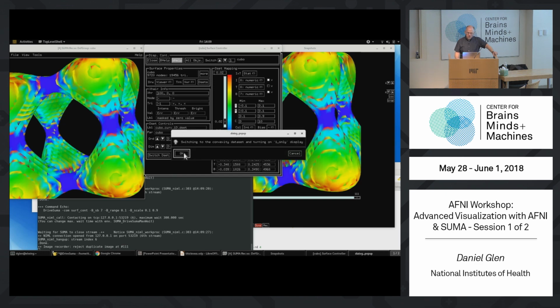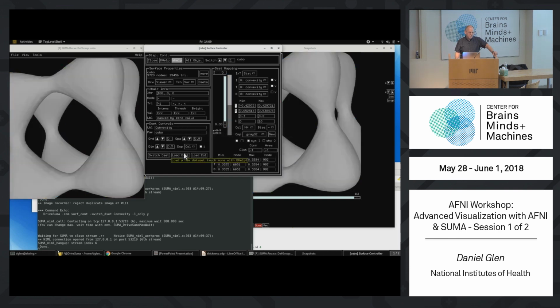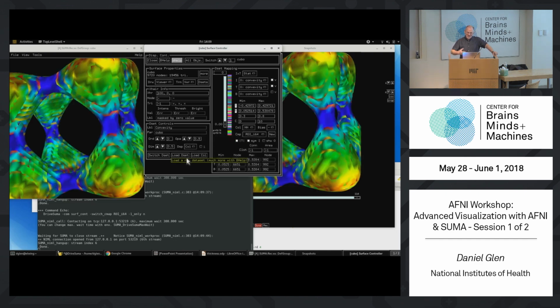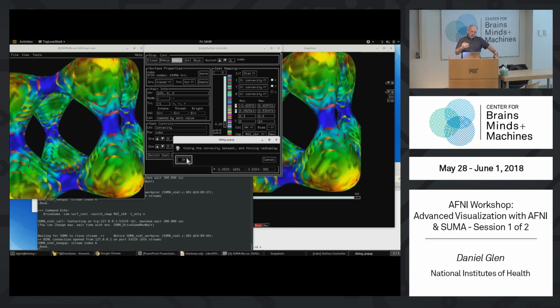And now it's going to show us convexity, back in the default. And change the color. A lot of examples here. These are all examples of how to change color scales. It's mostly here as an example. All the lines there are something that you might want to do, so it goes on through a lot of different variations.